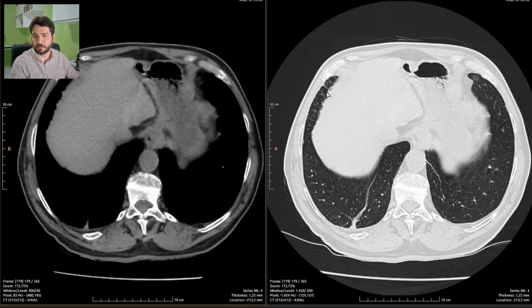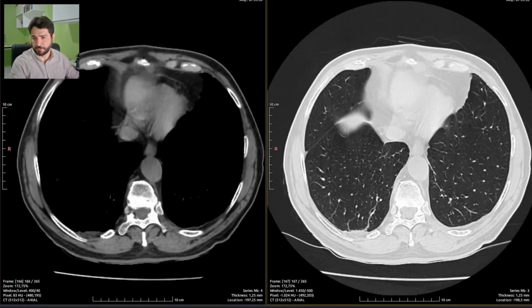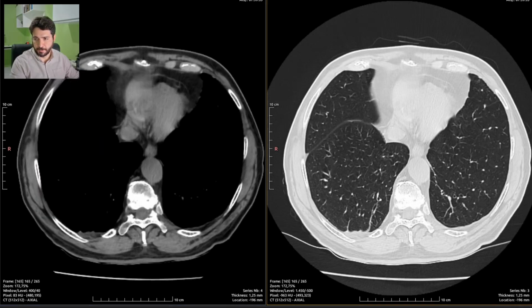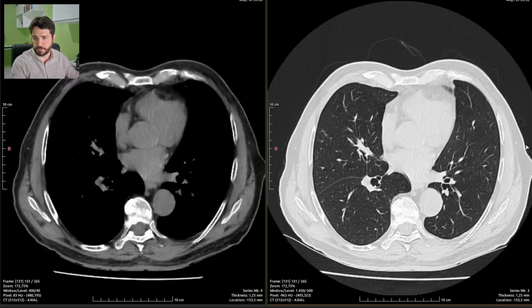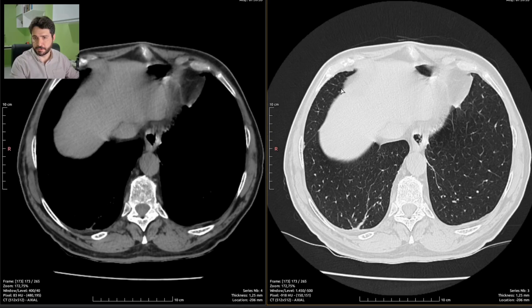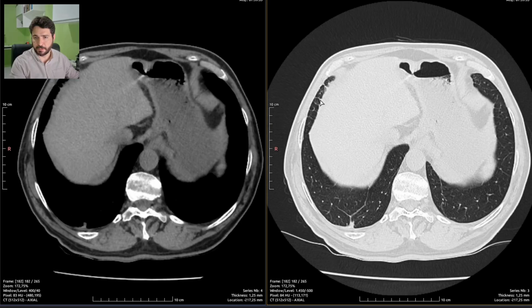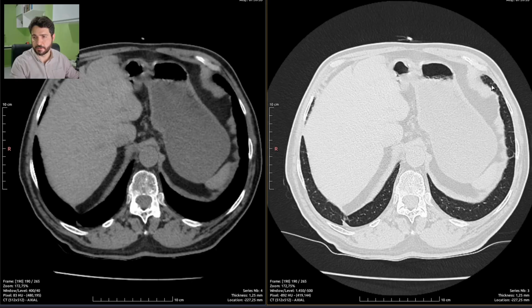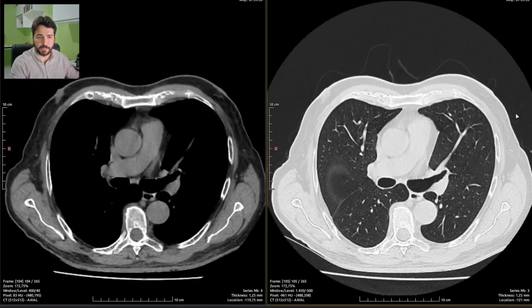We usually also see that kind of finding on both inferior lingular segments and middle lobe segments, which we can see if we really look for them right here and right over there. So this is a quite normal exam.